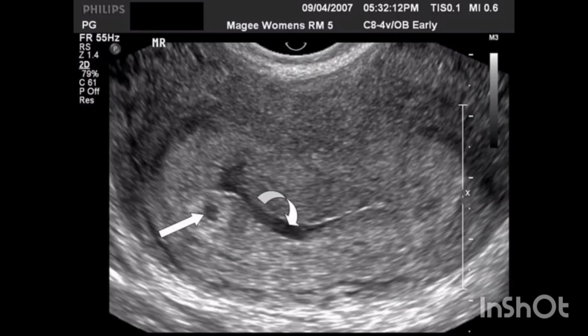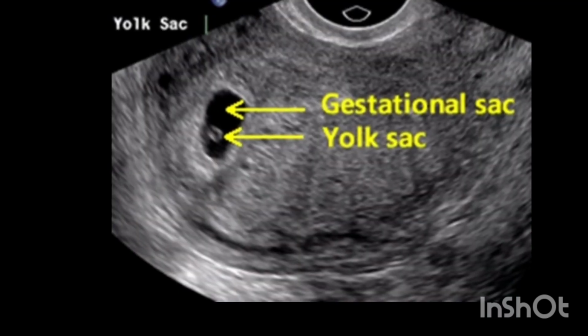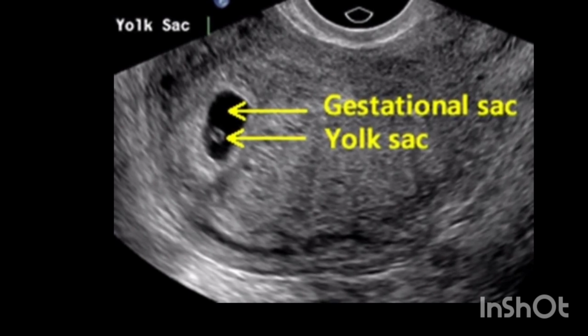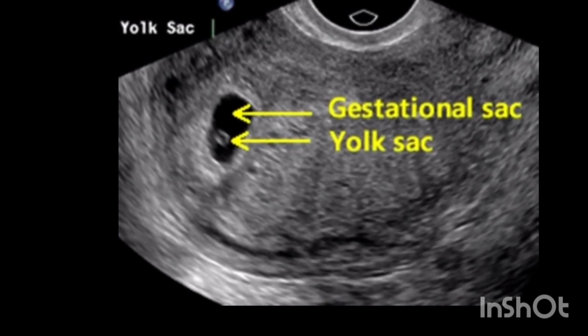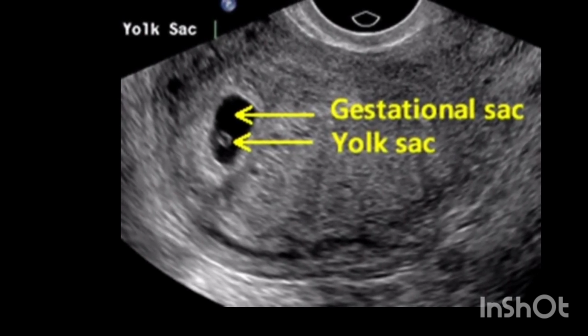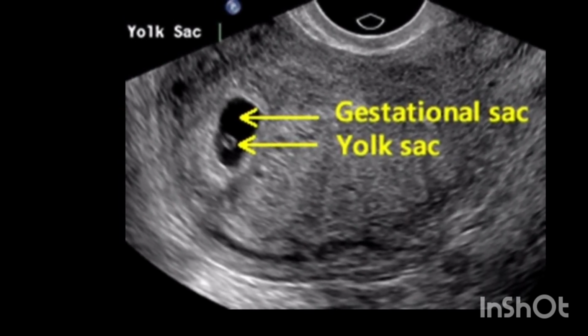1. Its normal eccentric location. It is embedded in the endometrium rather than centrally within the uterine cavity. 2. Presence of the double decidual sign, most helpful at 4 to 6 weeks. 3. Presence of a yolk sac. Seen at approximately 6 weeks, unequivocal evidence of a gestational sac. However, caution should be exercised with a diagnosis of a pseudogestational sac.